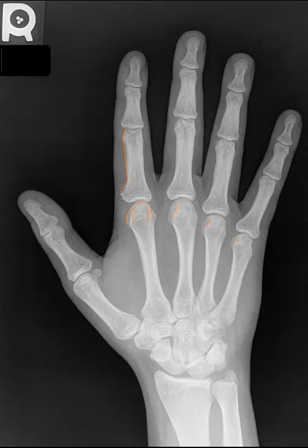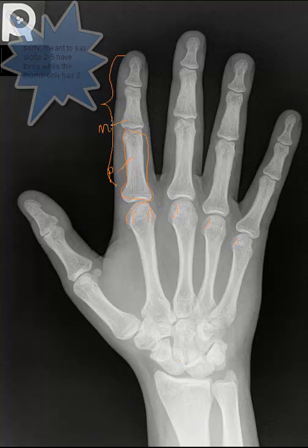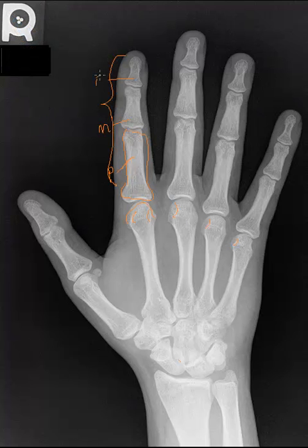Now the term phalanx or digit is also used to describe the whole finger. So if you say the first phalanx or the first digit or the first finger, or which would be the second in this case, second finger or second digit. Collectively, the 3 phalanxes comprise a single digit. Now, in digits 2 through 5, you have 3 phalanxes. You will have the proximal, you will have the middle, and you will have the distal phalanx. This is true again for the 2nd through 5th digits.